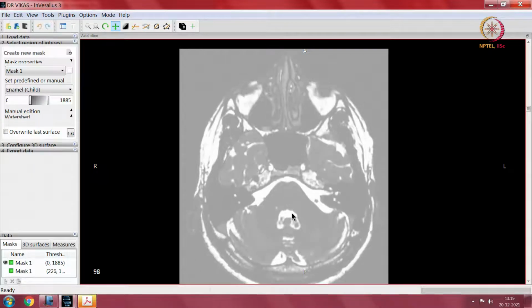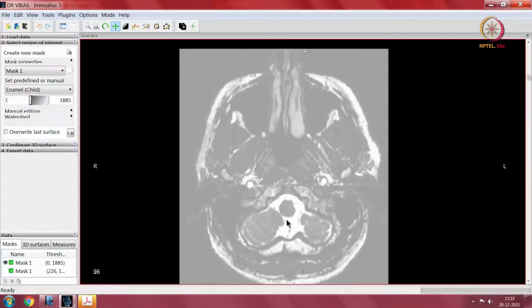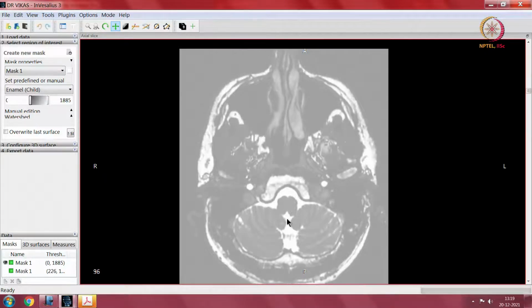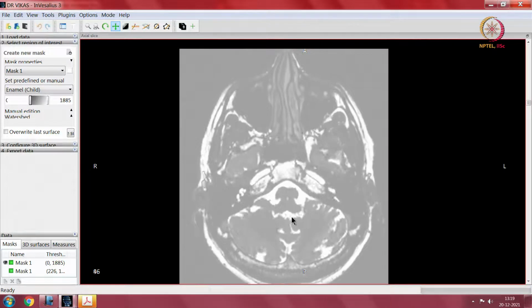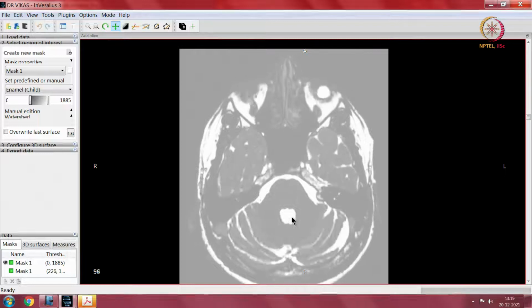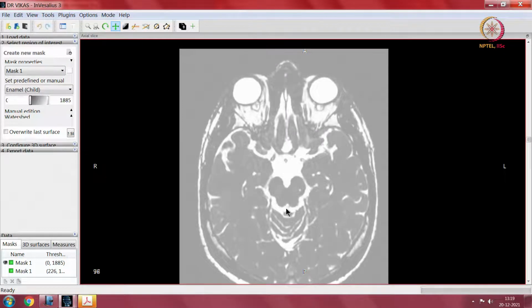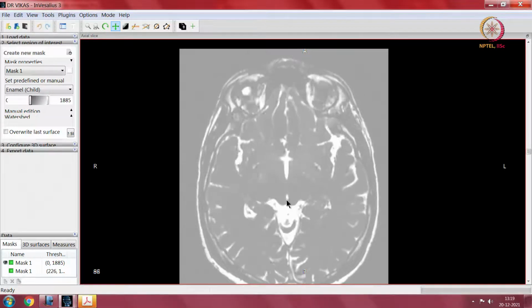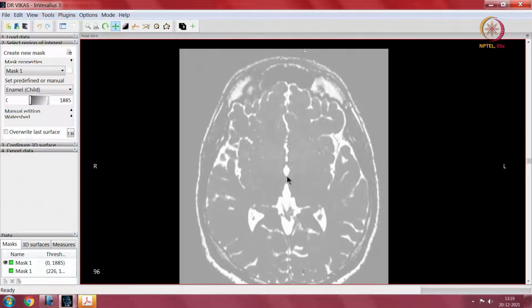This is the 4th ventricle. It opens to the outside through the foramen of Magendie here, and into the foramen of Luschka over here. So, that is the foramen of Luschka, that is the foramen of Magendie. We go up, that forms the aqueduct. This is the 3rd ventricle. So, this is the thalamic adhesion.